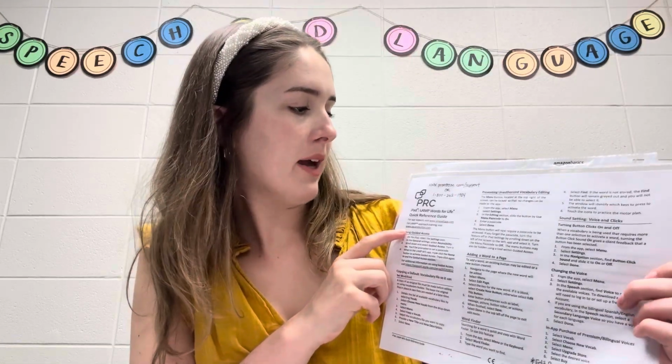To do this video, I'm using PRC's iPad LAMP Words for Life Quick Reference Guide. This guide can be very helpful in learning LAMP. It does have quite a bit of information on it, so I wanted to go ahead and make this video so that you guys can be equipped and know how to do this stuff without going in blind. Again, I'm just showing you a few things on these handouts that I think are the most important, at least for you starting out.